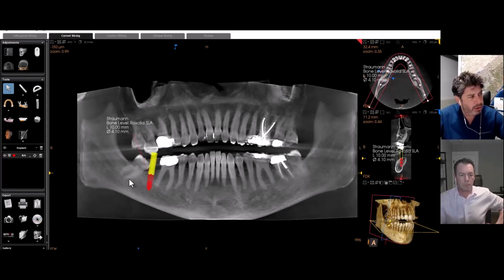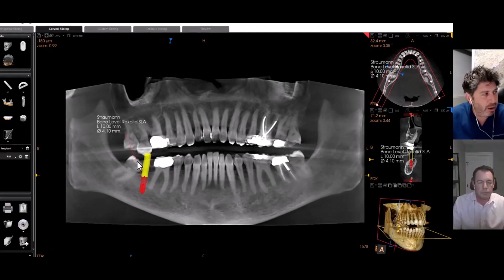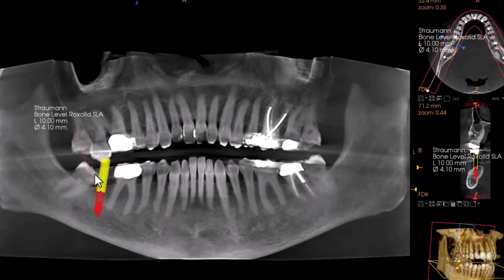So of course, here you're advising extraction of tooth number 32. If you're taking out 32, you most certainly should also remove tooth number 1, which would be unopposed and clearly would super erupt as 2 has. But here tooth number 2 has super erupted, and therefore, while you can place the implant, you don't really have enough space to put a crown in at the appropriate occlusal height. So this is a case where you need to work closely with the restorative dentist and the patient for them to make a decision as to how they want to handle this case.